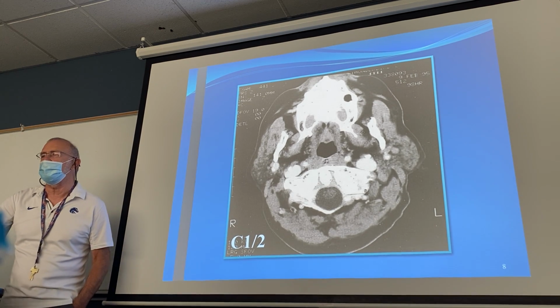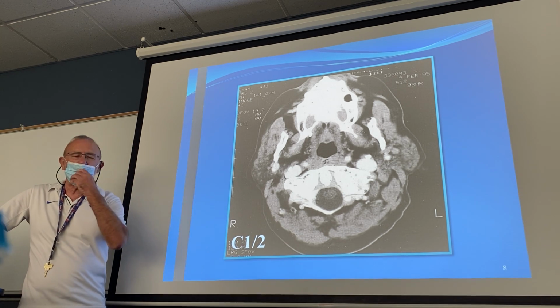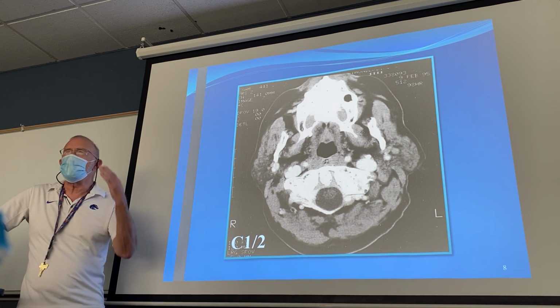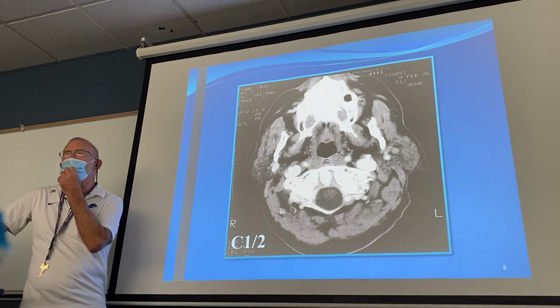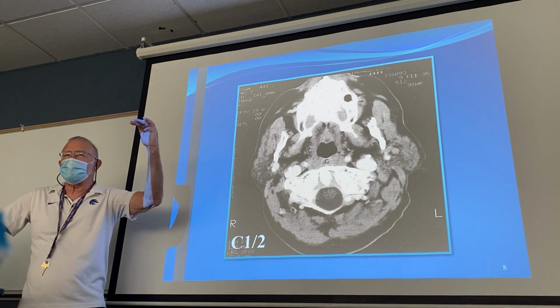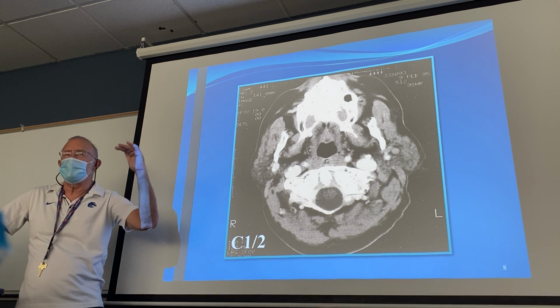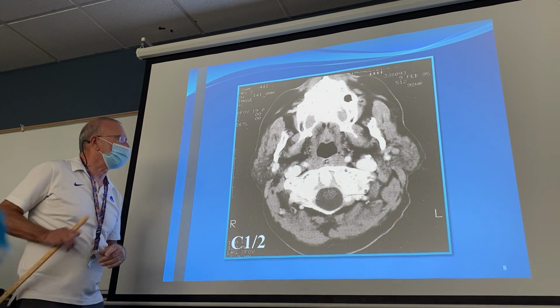Medial pterygoid muscle will be the last one, in addition to the masseter, that we'll pick up as we work our way from top to bottom. It will remain all the way to the body of the mandible. So from an order or transition perspective, you have temporalis, you have lateral pterygoid muscle, medial pterygoid muscle, and then on the outside you're going to have masseter.